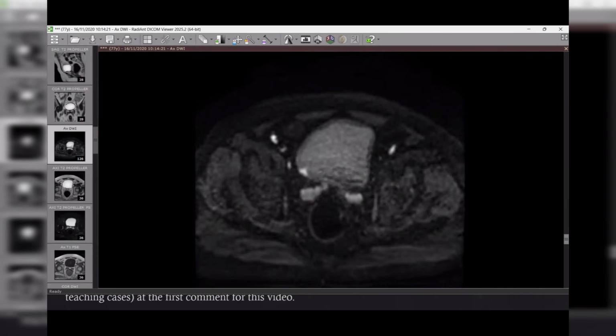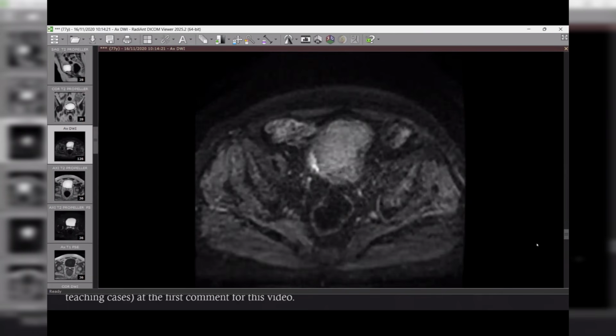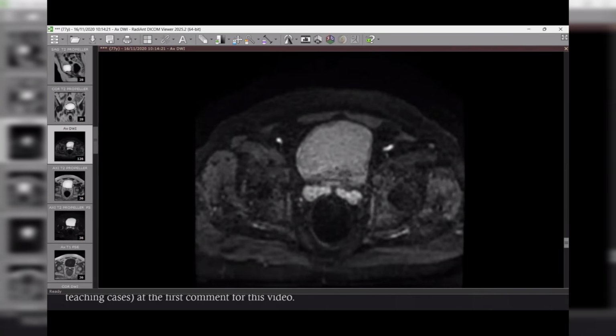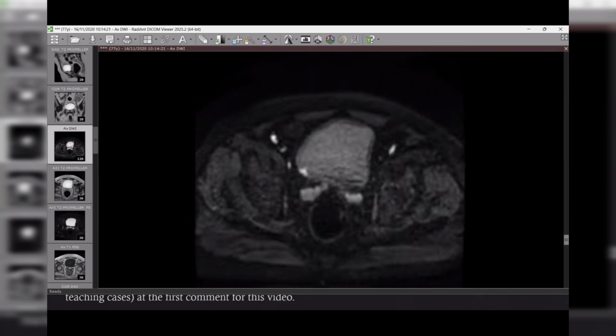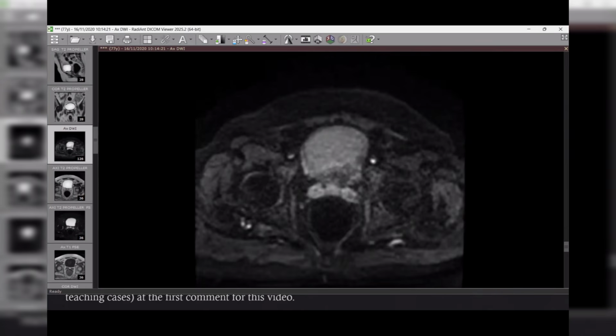Are you sure regarding the invasion of the seminal vesicles? No, I'm not sure about the seminal vesicle. Okay. So what's your next step?